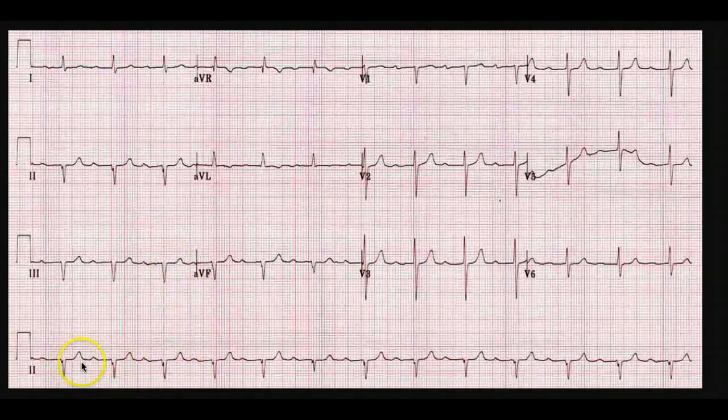So this is a typical example of an old infarct. We see the Q wave because of lack of electrical activity there, but really there is no ST segment elevation. So don't be alarmed if you see it in a patient who walks in for a regular checkup. They're just having a normal Q wave from an old infarct, because once you have a Q wave, it will never go away unless you perfuse them immediately.